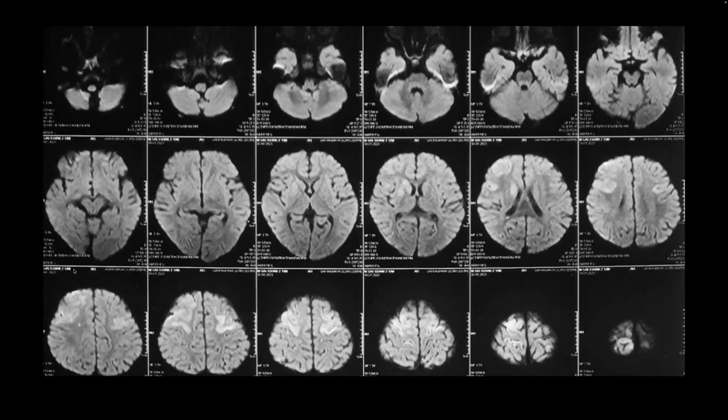So I have diffusion panel over here. I'm not sure if you can clearly appreciate, but here you can see that there are areas of restricted diffusion in the bilateral frontal regions. If you see the lower panel, predominantly involving the cortical regions. While coming down more inferiorly, you can see that there is basal ganglia involvement. At this image, the right basal ganglia is more predominantly affected in comparison to the contralateral side. Coming more inferiorly, I do not see any other areas of ischemia or infarct.